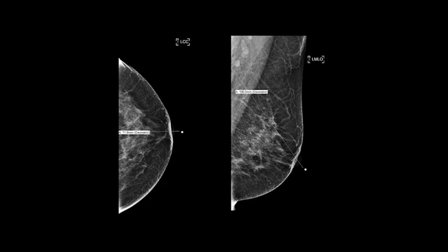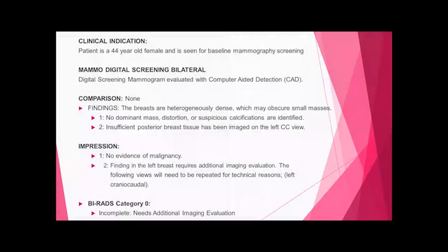It's a good thing to call the patient back to be able to get better images for the patient. But they did no comparison studies, so there's no way they knew if they had gotten sufficient, but they did use the posterior nipple line measurement. And our radiologists use that many times. If they feel that there's inadequate tissue on the MLO or CC, they'll use their tools and they'll get the measurements.